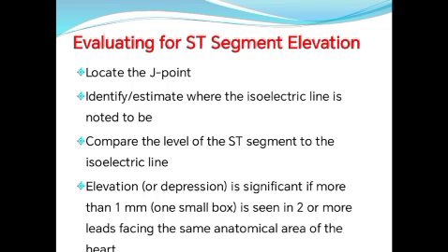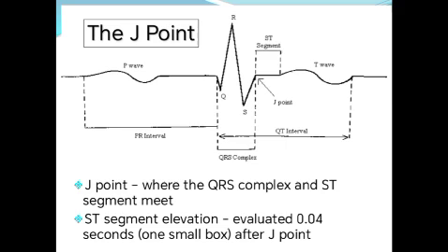Okay, elevation in certain people, for example in a young male less than 45, should be more than 2.5 millimeters, especially in leads V1, V2, V3. Sometimes we have a normal elevation less than that in this young male.